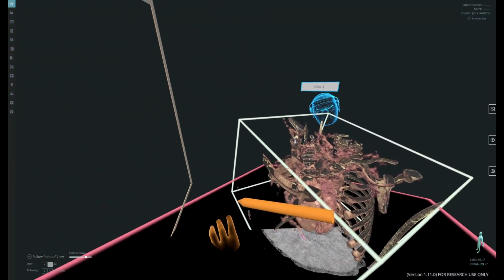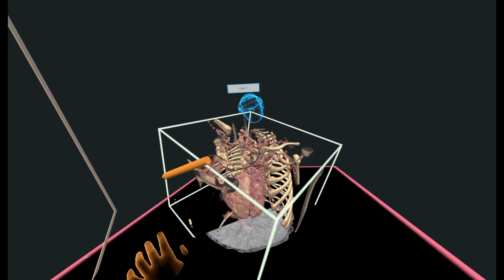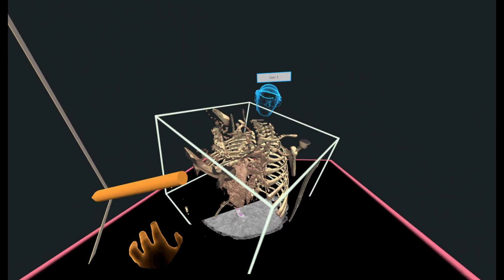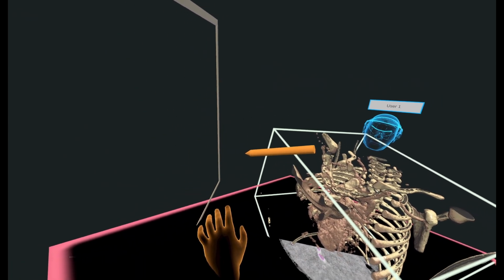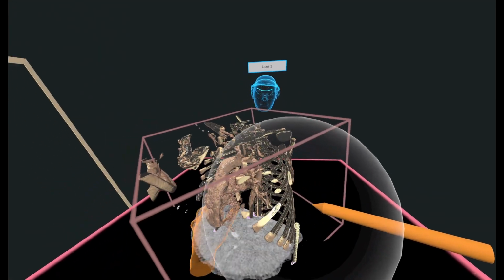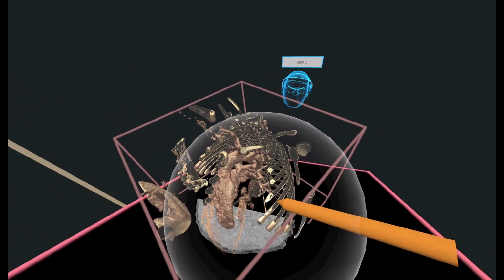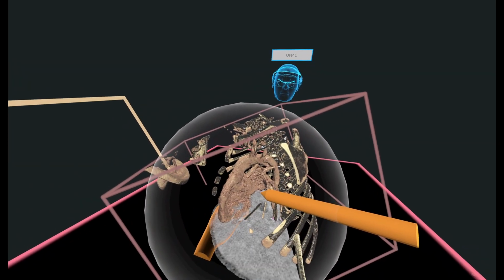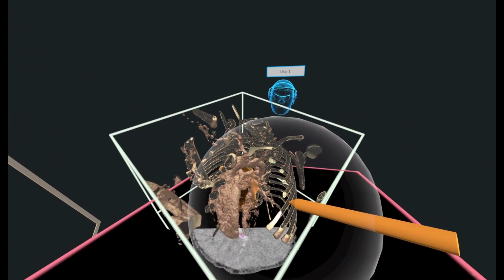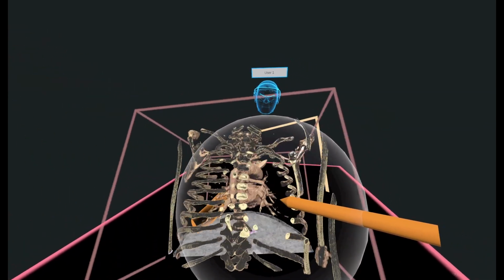We can keep working on that too, if we just highlight that area for the PDA. It's easier to do. We just change some of these features. I also brought the ribs more in contrast, and we can remove those later with cleaning. There's a way to place a mask and hide all those things. But that's a nice thing, showing the stump of the pulmonary artery with a big gap to the RV. The branch PAs look fine, but the duct is inserting into the LPA, which tends to be a challenge, but technically was fine for the ductal stent.